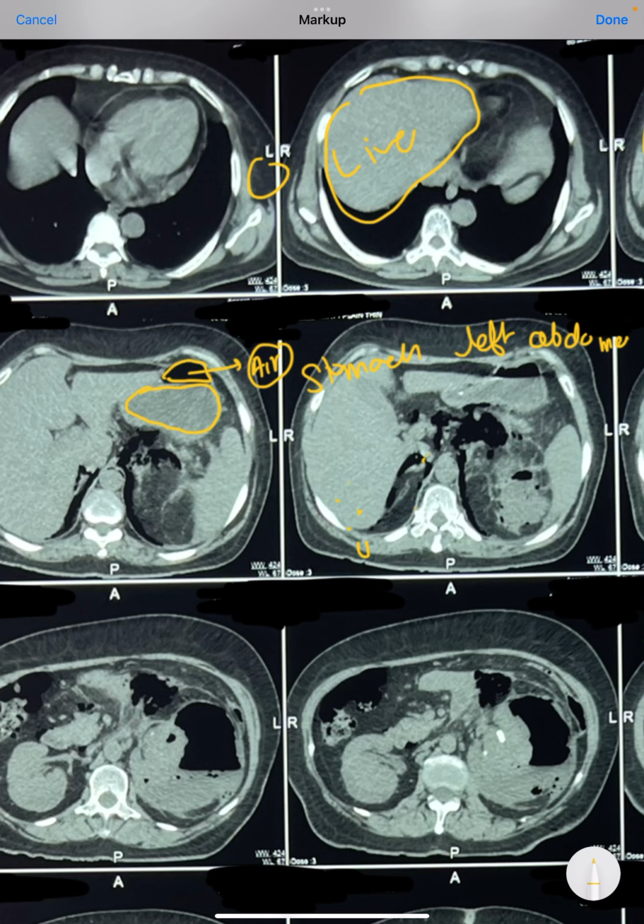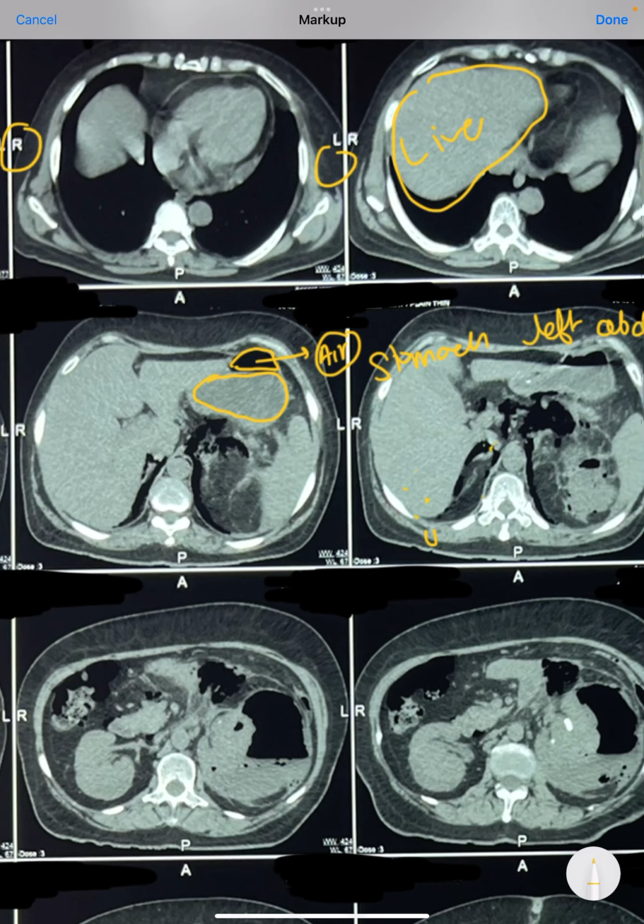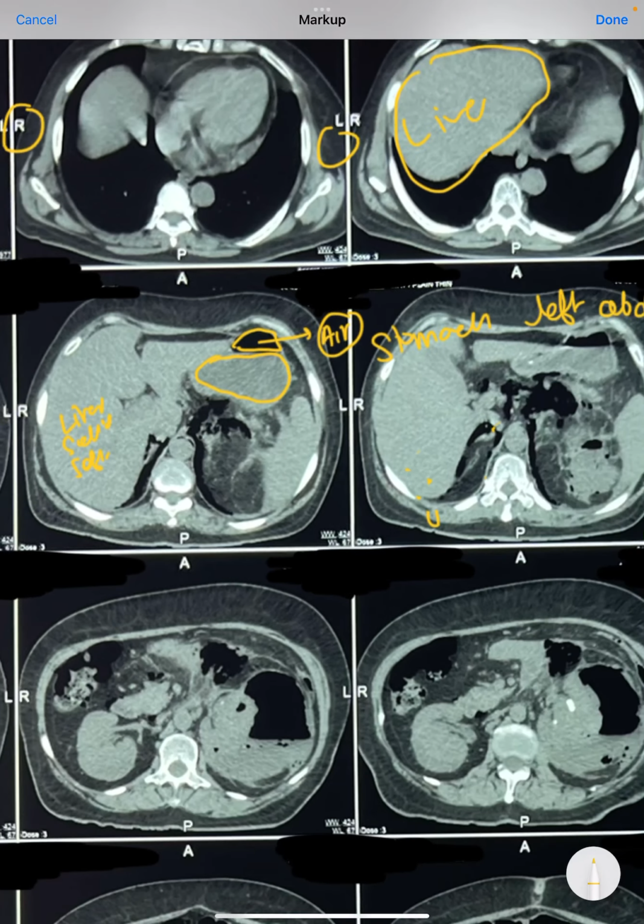slightly blackish thing. So just compare the blackishness of this liver, which is a solid organ, a soft tissue organ. So it is more dense. The most radiodense or most dense white structure is bone. I have told this earlier so many times. Bone, blood, calcium. These three things appear dense white on the CT scan.